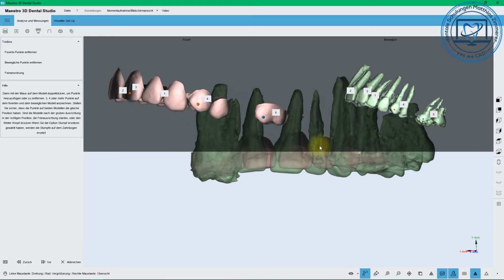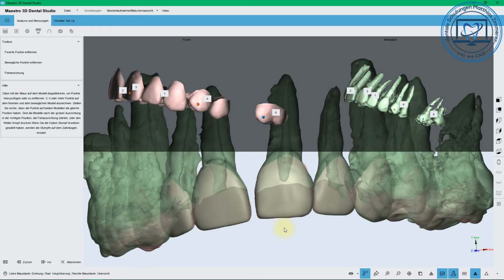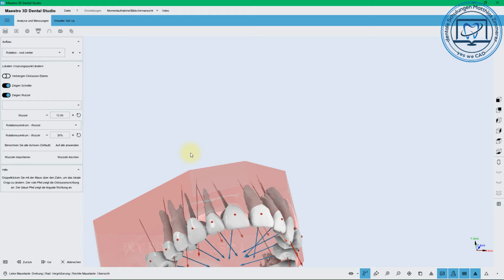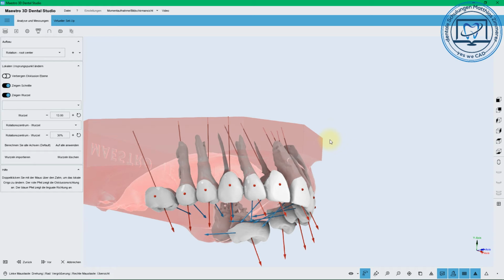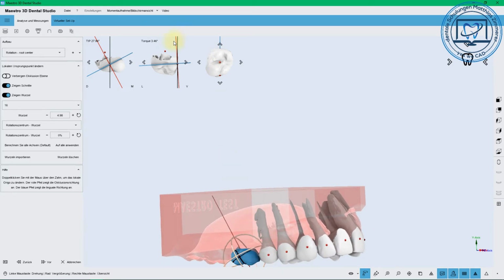The software automatically positions it, just put the points on the teeth, and you can remove them, and in the fine adjusting you will get the roots adjusted to the teeth. The software is calculating, and then you have the optimized result, and like seen on the 6, there is nothing. And if there are some teeth with root filling, it's also a little bit tricky.